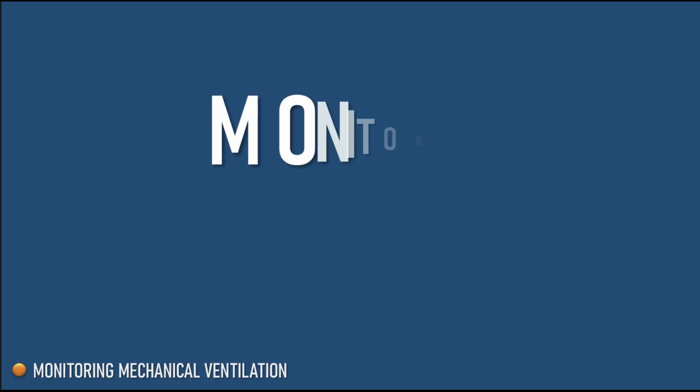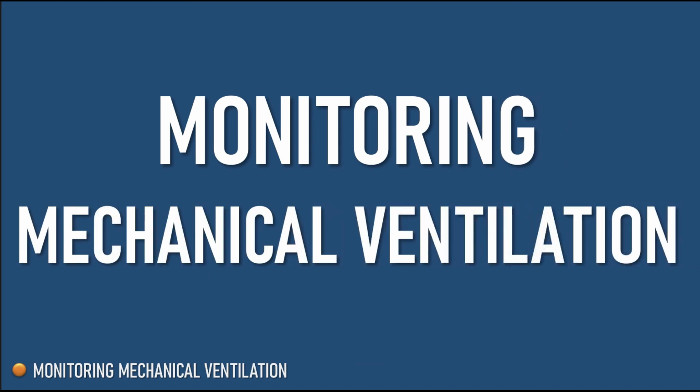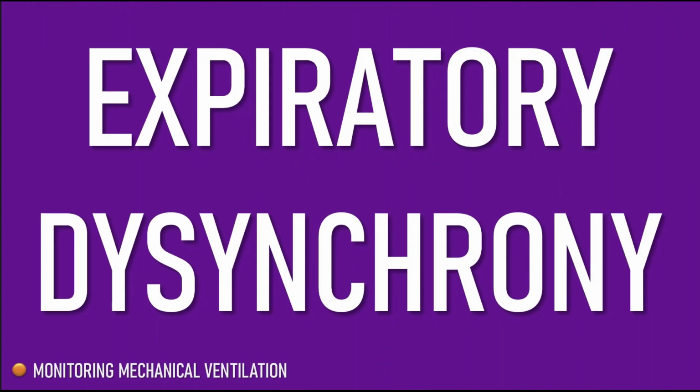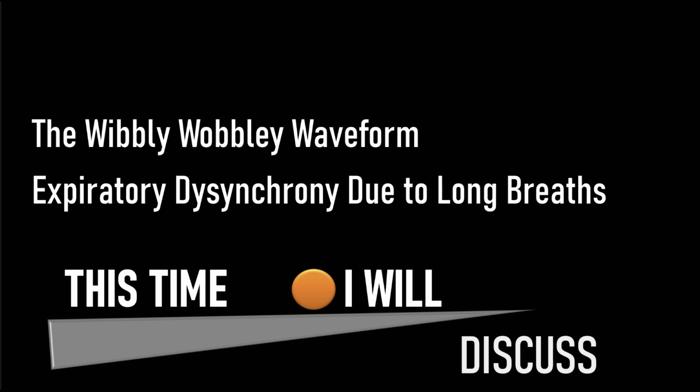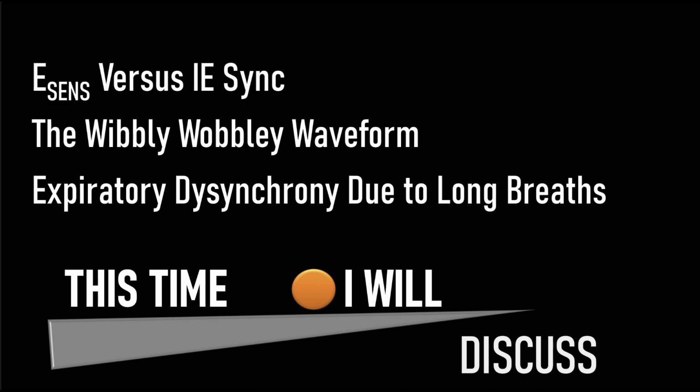This is a series on monitoring mechanical ventilation, and this tutorial is on expiratory dysynchrony. This time I will discuss expiratory dysynchrony due to long breaths, the Wibbly Wobbly Waveform, and expiratory sensitivity versus IE sync on Puritan Bennett ventilators.